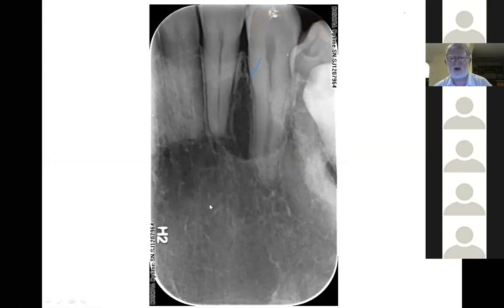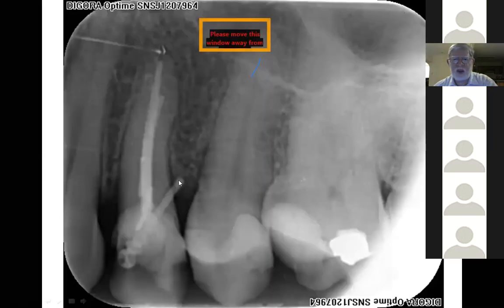He suffers from multiple sclerosis. He's wheelchair bound. His mum's looking after him. He's maybe in his late 20s. And their decision with the oral surgeon was that they were going to leave things alone. They weren't going to do anything more. When I read about the solitary bone cyst, apparently it has a very, very friable lining. One either enucleates that, or in his case, they decided to leave it alone.